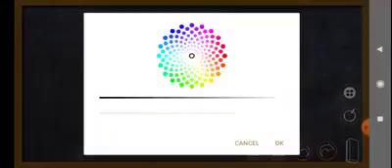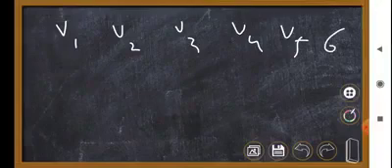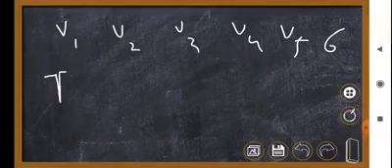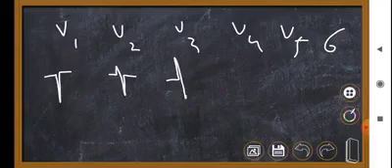If I draw the ECG complexes like this, for V1, V2, V3, V4, V5 and V6, we observe something like that. V1 is negative, in V2 there is a slight R wave, and in V3 there is almost a balance of the R wave and the S wave.